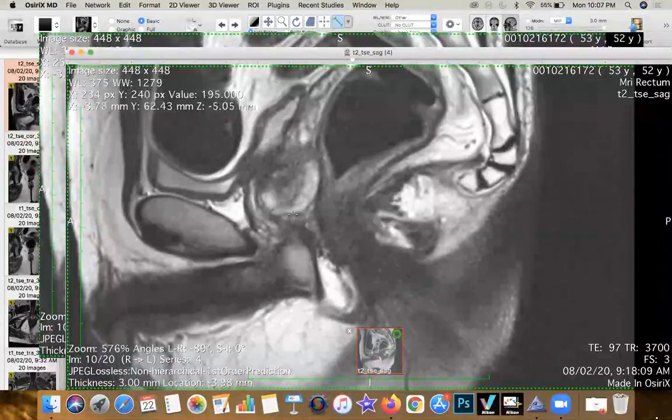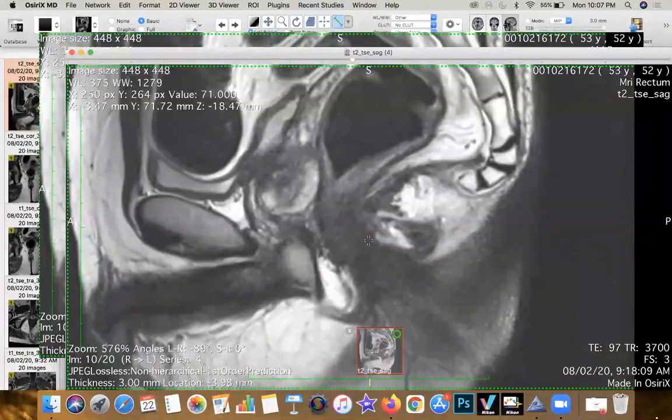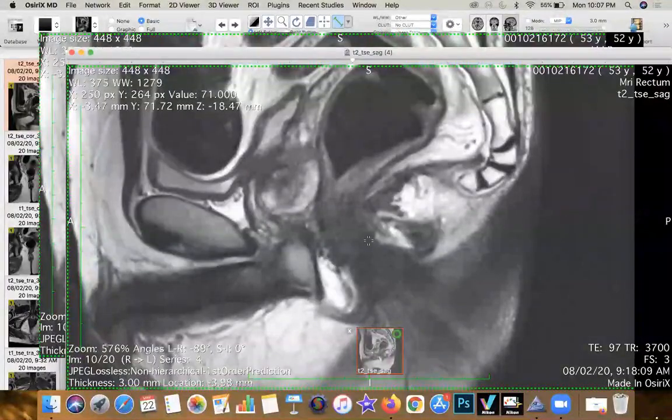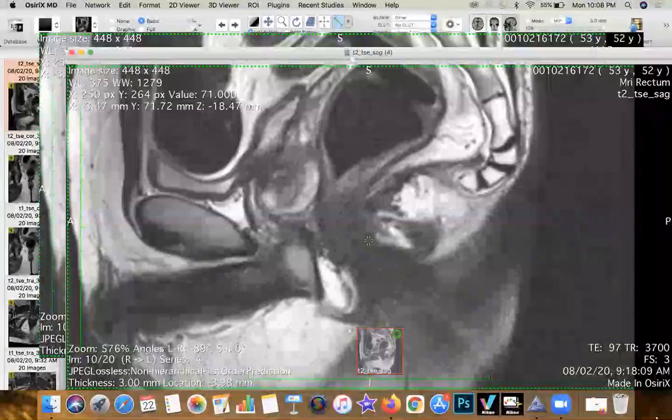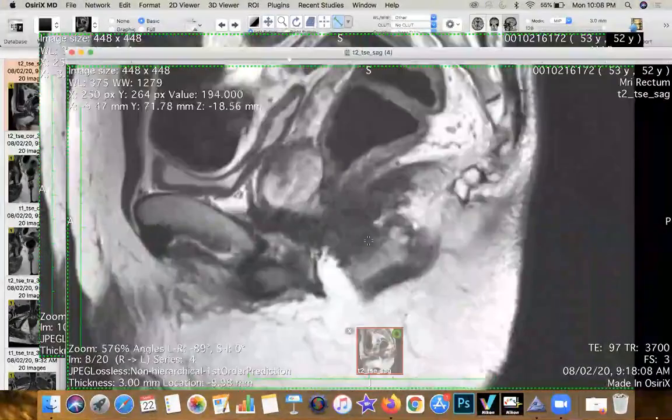Now, a normal hiatus, a normal anorectal junction angle means that the pelvic hiatus is pretty good. The puborectalis muscle is doing its job, and therefore the pubococcygeal line at rest is also going to be essentially normal. What is the next thing which you've got to look at? The next thing which you've got to identify tomorrow, which he'll show you, is the M line.